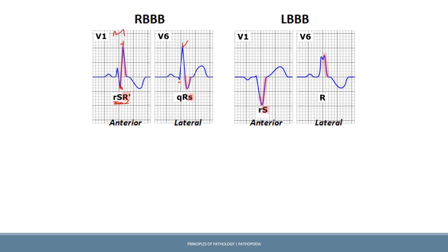And this one would be W, not very clear over here, but here we are definitely seeing the M, right? So this is self-explanatory.